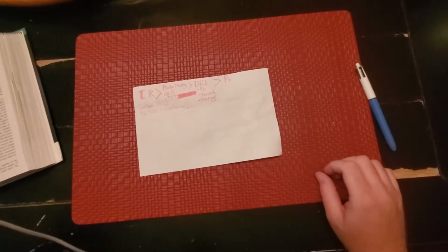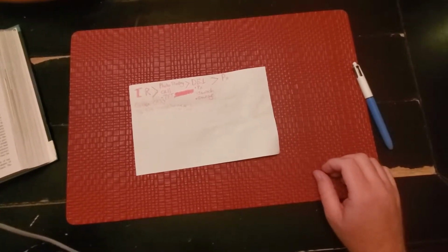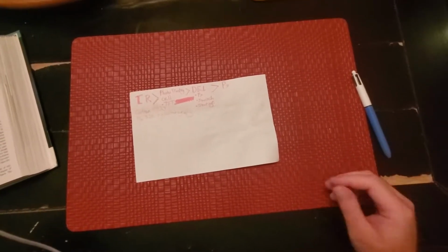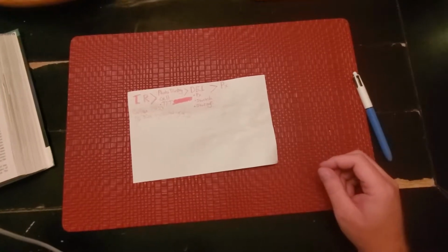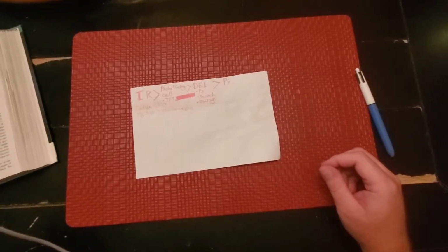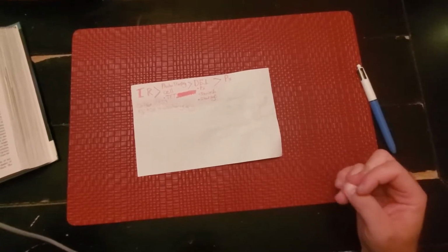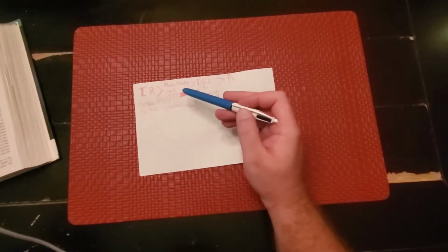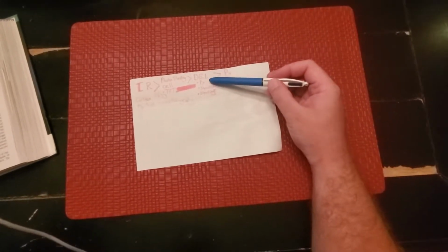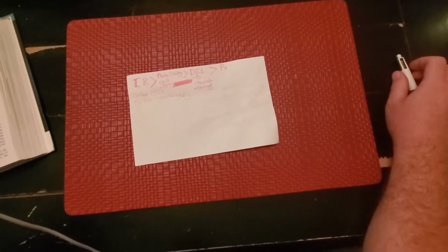I'm a Red Tech student of 2019, and I'm coming to you today to do a little bit of a demo about digital radiography and some things that are sometimes a little confusing. I wanted to help you visualize some of them. We're going to talk about the IR, photo timing cells, and then go a little deeper to the Del, and then deeper to the pixel, and finish off with some digital.